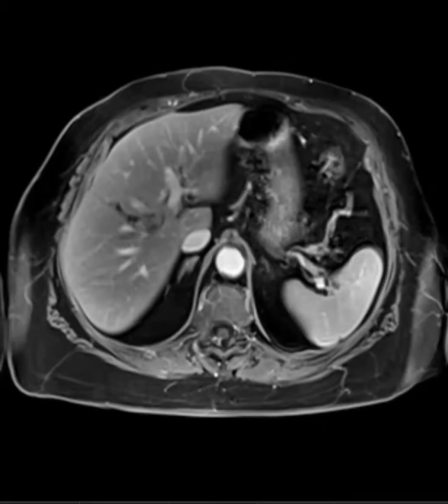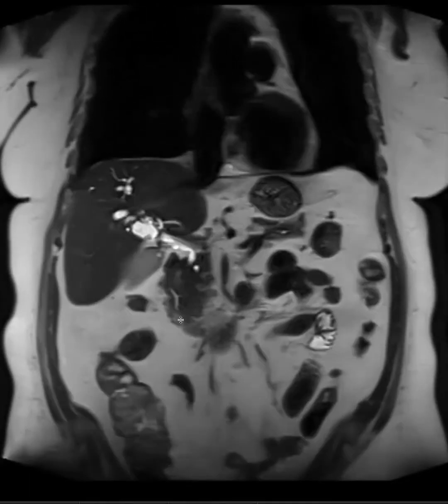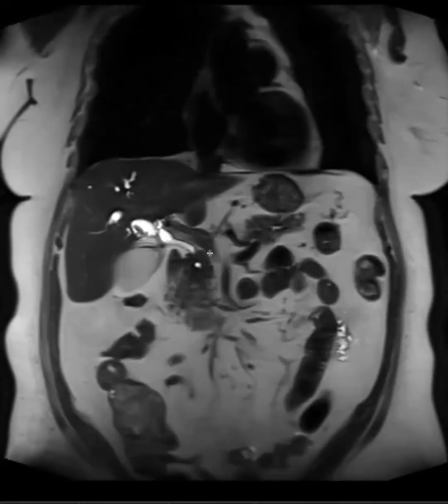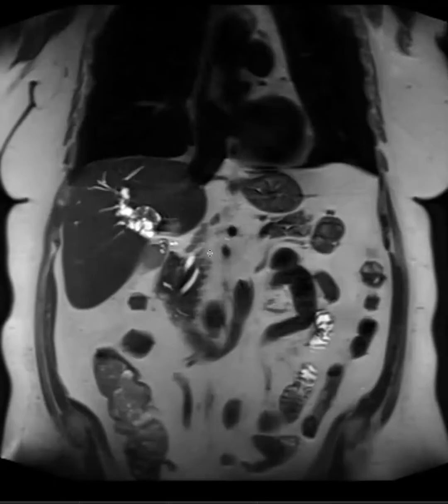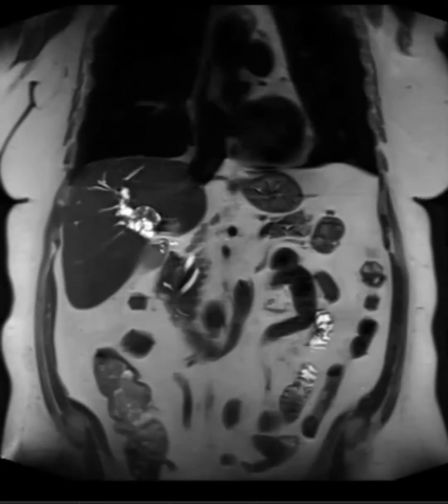Good. So this patient had spyglass, and that's what it came back as, IPNB. Actually, this looks papillary-ish, polypoid soft tissue in the intraluminal region of the bile ducts. Nice.